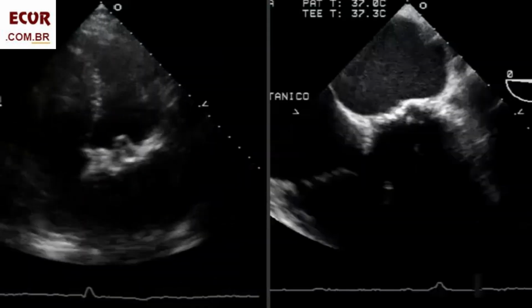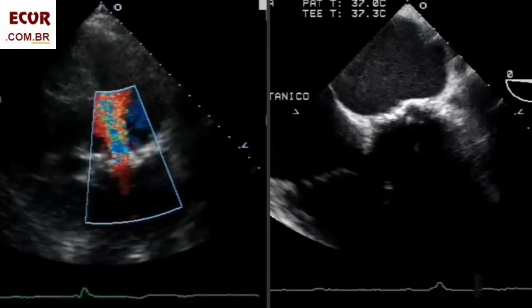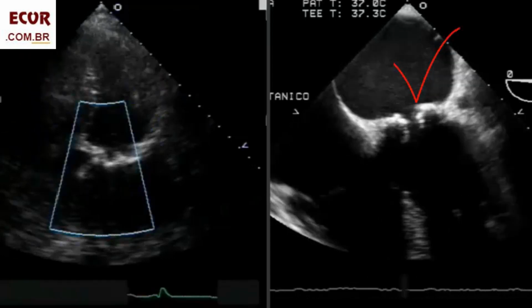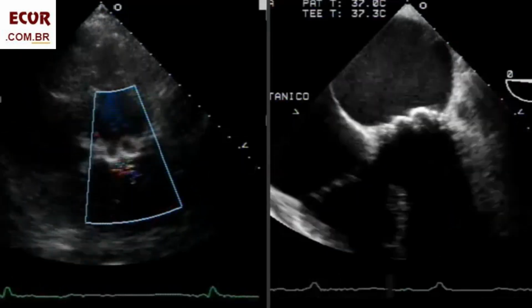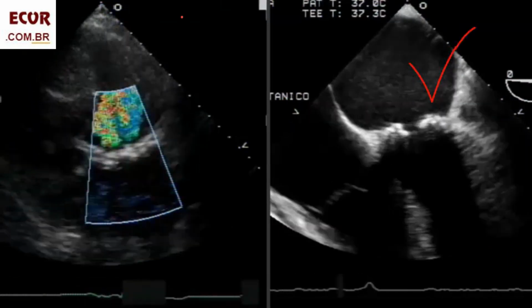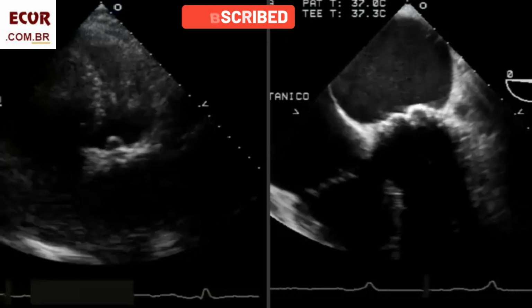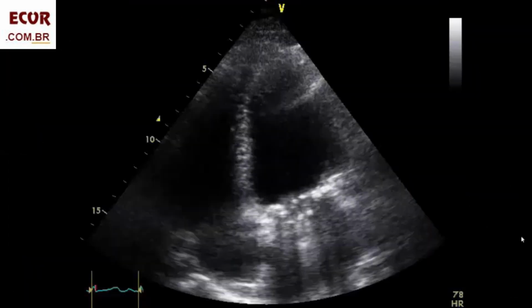Shows severe impairment. Pannus involving the mitral bioprosthesis with these dense echoes, mainly in this leaflet here. But all leaflets are involved, as demonstrated in the transgastric short axis view. See how the echoes dense thickening is not gross and comes from the region of the sewing ring and involves the proximal region of the leaflet. Distal regions are less affected.